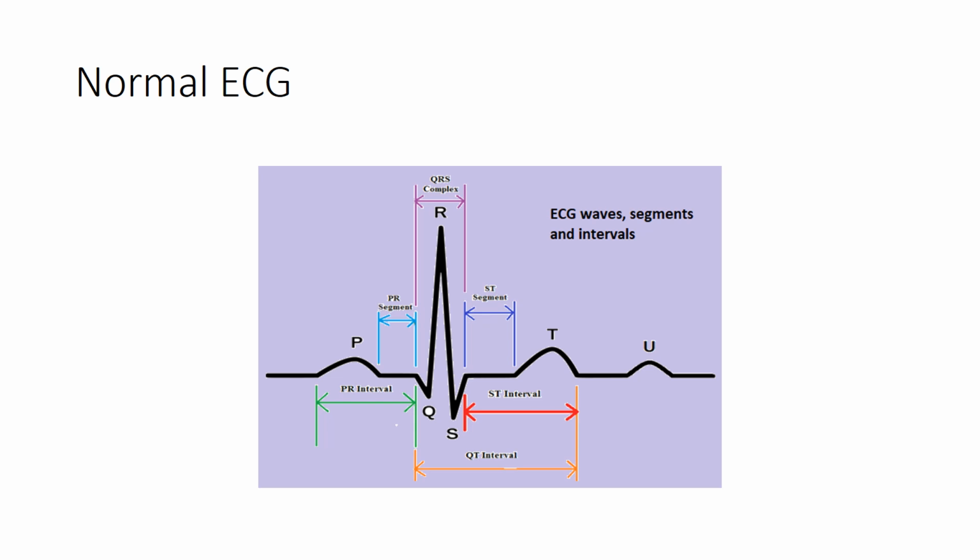During ECG tracing, in some patients, another extra wave is noted after the T wave, which is a small deflection termed as U wave. Its significance will be discussed later in this lecture or the coming lectures on the ECG.